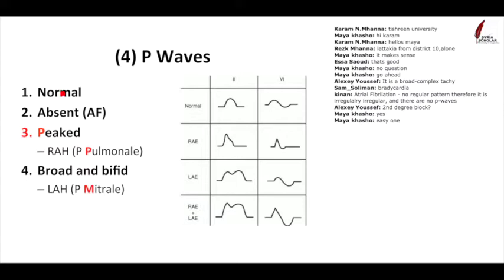But again, don't worry about that. It's mainly, are there P waves or are there no P waves, which means AF, and do the P waves look roughly normal, or do they look a bit strange? That's the thing you need to first of all think about when you're looking at P waves.